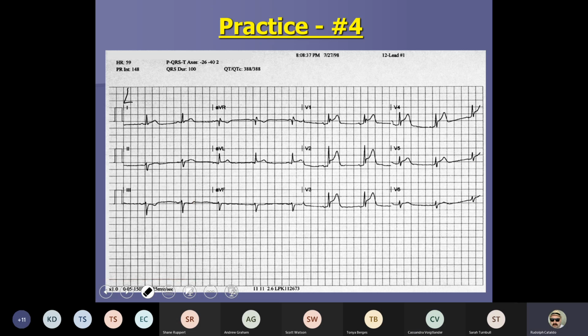Now, actually, Cassie, you can talk me through this 12 lead pretty easily. Oh, great. Tell me what you see. Well, it's off in La La Land at the end of V4, 5, and 6. I don't know if that is just like a bump or something. Okay. We've got elevation in 1, 2, V1, V2, V3, V4. I would agree. So we've got elevation there.